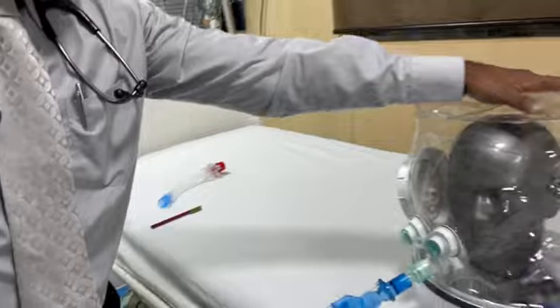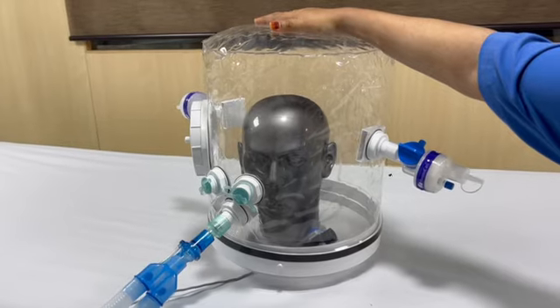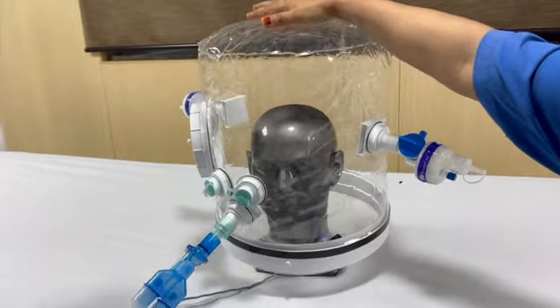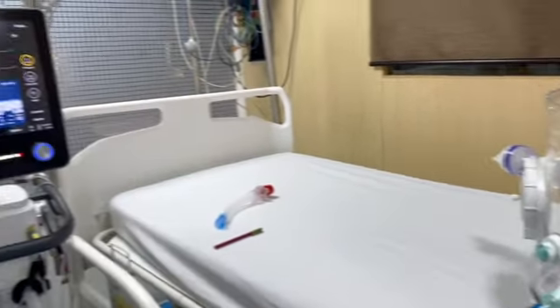Can somebody hold this please? So we have not put the stirrup, so I'm hoping that, this is how it inflates. And once it's inflated, it's inflating. Okay. The stirrups will not allow it to go up per se. Of course, we have not put the stirrup, so it's kind of going up over here. But if you come here, you can see what's happening here.